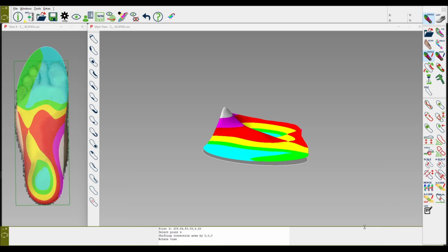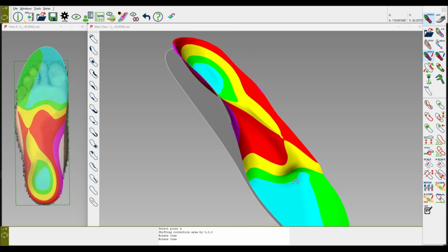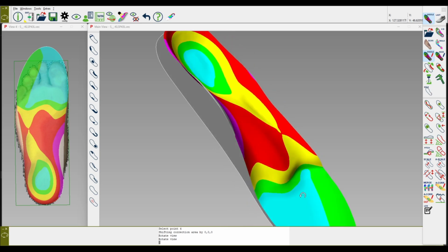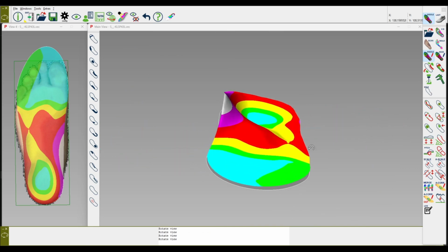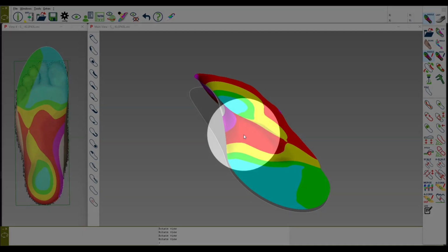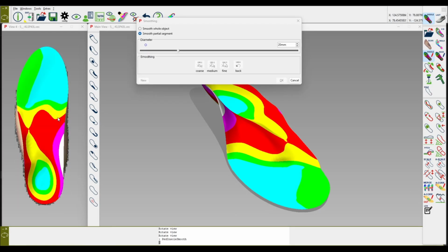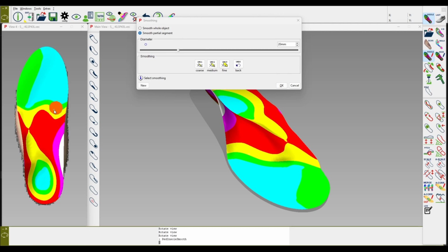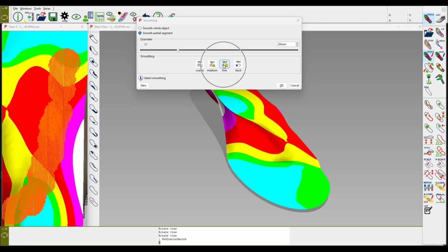Increase the effective width, and if there are some harsh transitions that we can't see here, but if there would be, sometimes depending on the height, maybe there are some transitions here, some edges. You can also take the smooth function and go in that direction where we added the elements like this, and just smooth it.